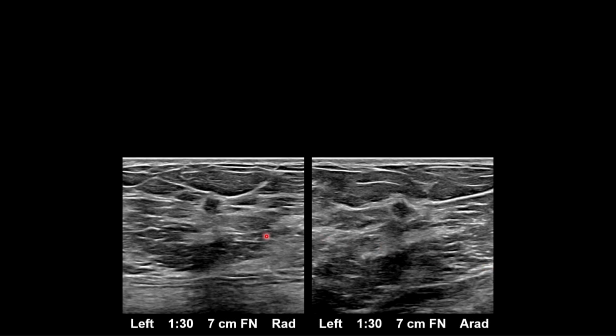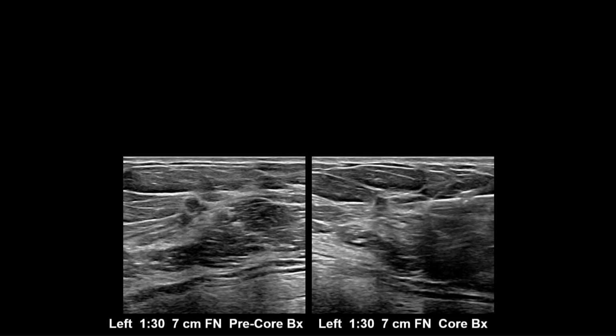I don't have it any bigger than this, but it's got angular margin. It's also got that echogenic rind that you saw yesterday. That's a new term in BI-RADS, will be. This is suspicious at ultrasound. So we can do an ultrasound-guided biopsy. Hard to hit, but if you're good, you'd get it right in there.